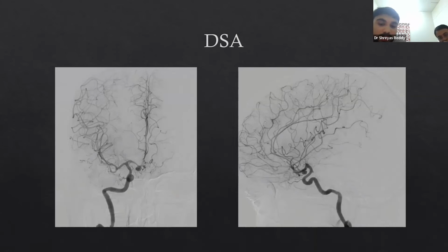What are the things that will tell you that this is a very high risk aneurysm which has a rupture? We can see that the surrounding vessels have gone into vasospasm. What is the criteria? The size of the aneurysm is more than 5 mm, a daughter sac and a teat tell you that this is an aneurysm which has ruptured.